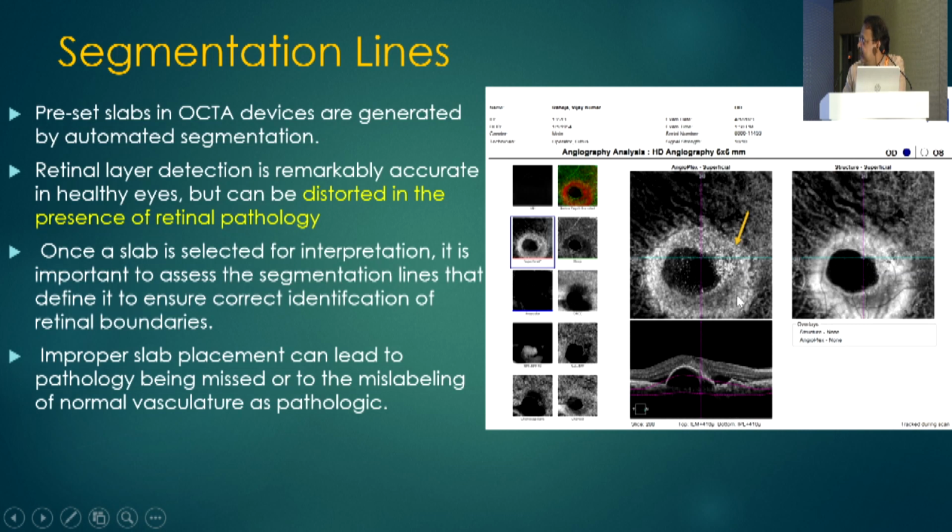And in this patient, you can see a BVN, which is suggestive that this is a patient with polypoidal choroidal vasculopathy. Within the edge of the PED, you can see a branching vascular network.